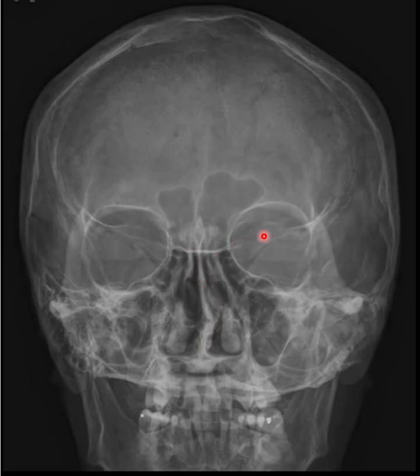We can identify the lesser wings of the sphenoid. They kind of are like this, swoop horizontally across the orbits of the skull. So that would be the lesser wings of the sphenoid. And then if we follow this line here, this is the greater wing of the sphenoid there, coming up more vertically. So those lesser wings are more horizontal. The greater wings sit more vertically, and both of them kind of superimpose the orbits in this image. All right, and we can follow those lesser wings around to that coronal suture.